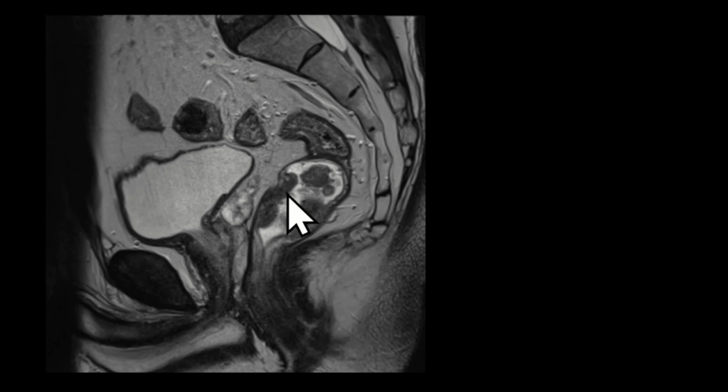Also important, after treatment, tumors can undergo a mucinous response. If you see pure mucin pools, which will be T2 hyperintense without internal enhancement, that is a good thing and indicative of response to treatment. We'll cover post-treatment imaging and mucinous response to treatment in more detail in our course.